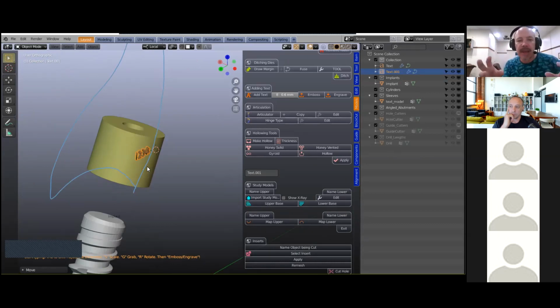The meshes can be together and they print perfectly, and they will also mill perfectly. If you start doing Boolean functions and unions, remember a face on a face will not join and it will not cut. So Boolean operations are useless if the objects are face on face. Just something to remember there.